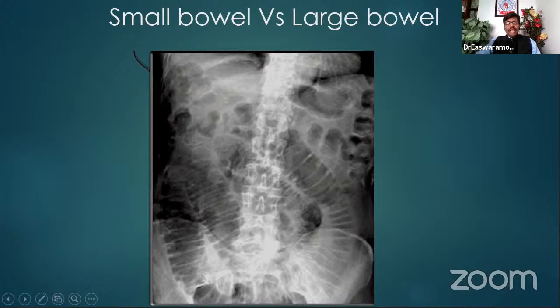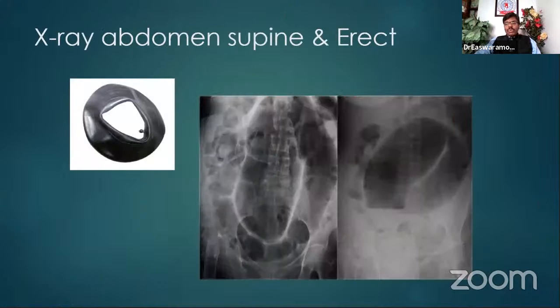Okay. Next, this is a very classical one we have seen in a patient before. An elderly man presenting with severe abdominal pain, gross abdominal distension. His abdomen was so big, if it were a female, you would have said it is a twin pregnancy. And it is tense, tender, hyper-resonant. That is the finding clinically. And you do an X-ray, both supine and erect. So what is the possible diagnosis?